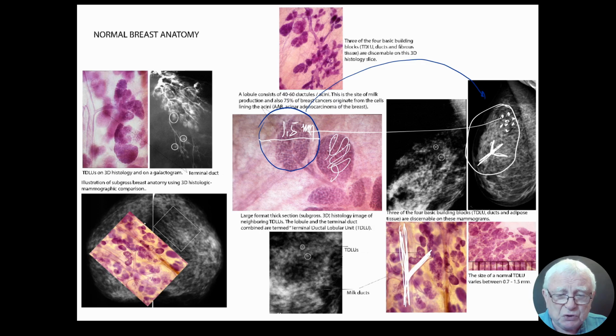Dear colleagues, these two are called the glandular tissue, but they are not hanging in the air because there are 2 connective tissues, the adipose tissue and the fibrosis that surround the glandular tissue. Certainly, if it's fat adipose tissue, that makes the radiologist look like this.